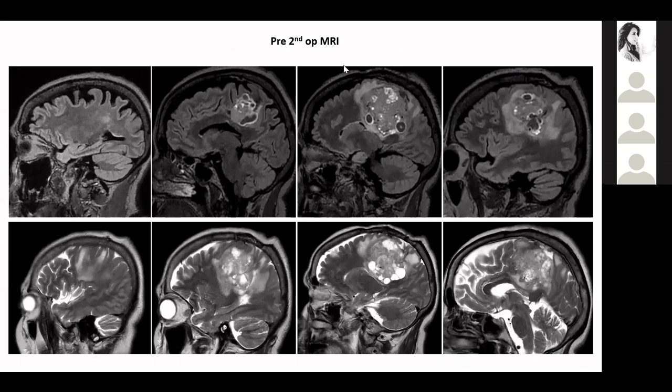So this is the same. I mean, this is from the same set, or is it from a different date? Yes, Dr. Shumala, it's the same MRI.